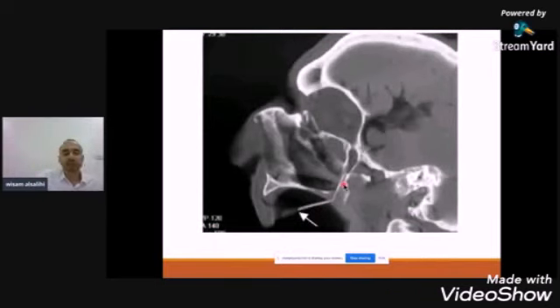We use the greater palatine canal to block the sphenopalatine artery through a needle in the greater palatine canal. We use this in FESS and certain dental surgery. We found this in the upper molar, midway between the upper molar tooth and the mid-palatal line. This is the cadaver, because there is air in the brain.